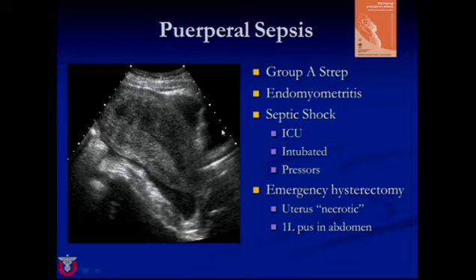You will note this is the bladder, so there's free fluid both anterior and posterior to the uterus, and it's echogenic, which implies it's particulate. We usually think about this in the context of ectopic pregnancy as being blood, but echogenic fluid can be pus as well because the white cells contribute to those punctate echoes that you see. And in fact, at the time of her hysterectomy, she had 1 liter of pus in her abdomen, but she lived to tell the tale.